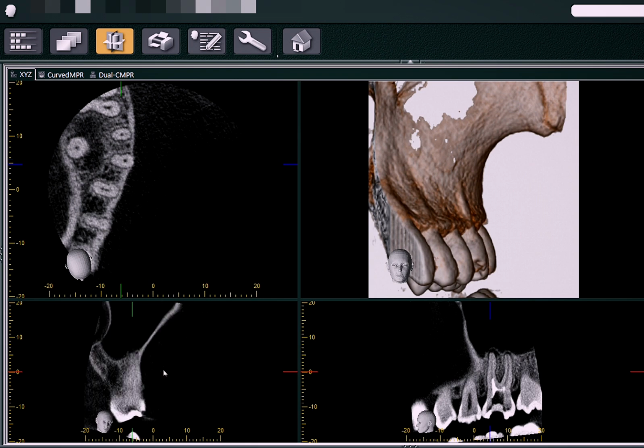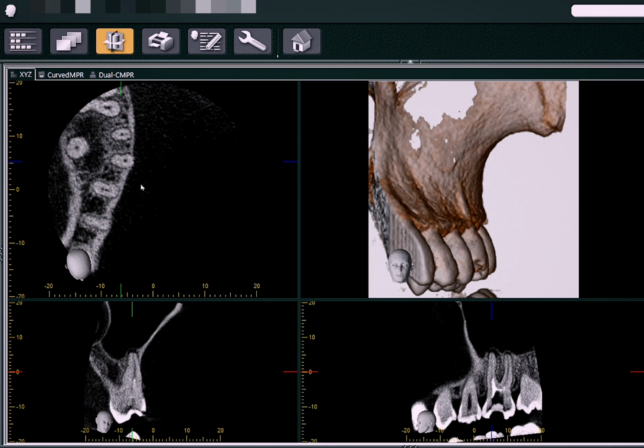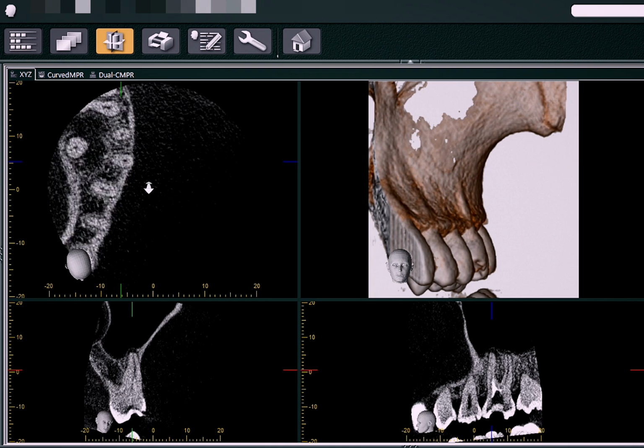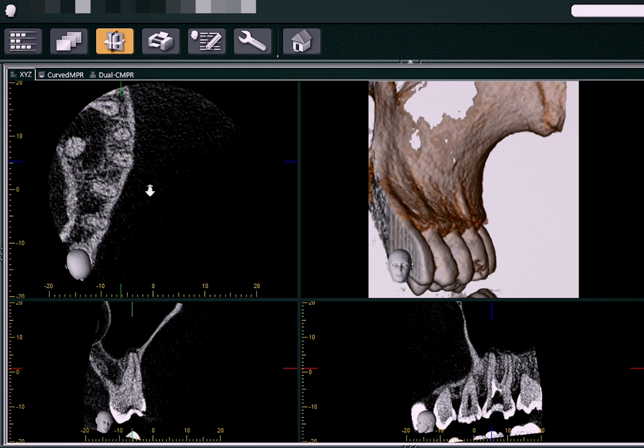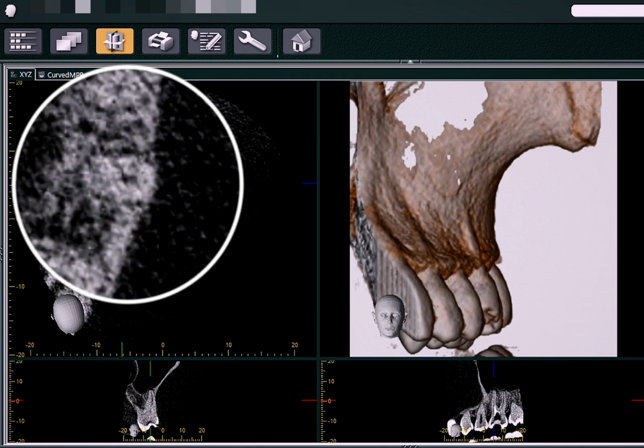So just to see if there's any kind of extra canal or not, you can study the same thing in smaller thickness. You can choose the thickness to be 0.5 mm instead of 1 mm, or even as small as 0.2 mm, just to check if there's any kind of extra lateral canal or not. As we go down towards the periapical region, or you can see the lower middle 1/3 region, you can see a small radiolucent line. This is the radiolucent line which is seen in the axial cross section. We'll just mark this line over here. This is the radiolucent line which is seen well.